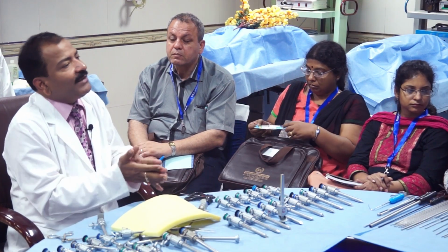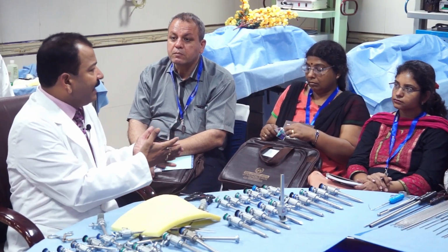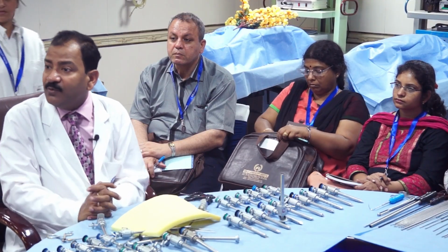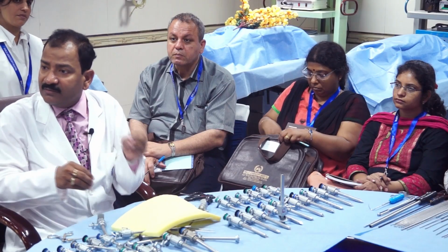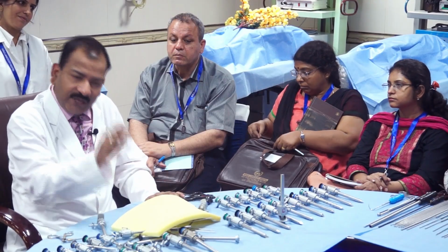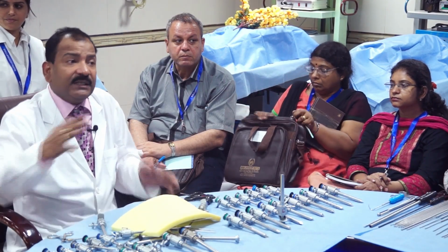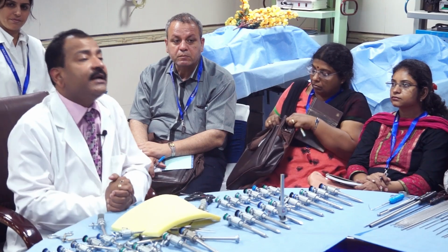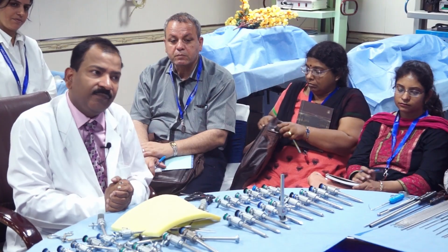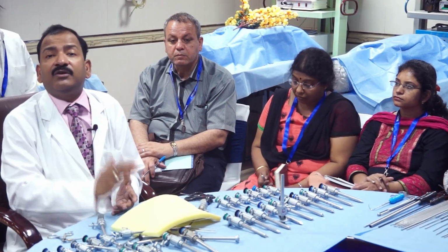You are doing the same dissection and tissue approximation for the uterus, he is doing it for the kidney, he is doing it for the gallbladder. We don't do anything extra, we don't put some salt or some spices there. We only cut and we seal and we suture. That is surgery. So the basic ergonomics is the same, just like driving a car. The skill of driving a car is the same, and once you learn driving a car, it depends upon you how you want to use that car.